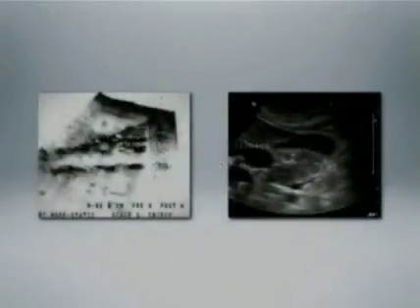If you've been practicing ultrasound for as long as I have, you may recognize the image on the left, which is an old black on white static image of an aorta that was taken in the early 1980s. At that time, static imaging was the mainstream and real-time imaging was not. But the clip on the right, which shows a gallbladder in real time, eventually became mainstream, and now clearly anybody would consider real-time imaging as part of mainstream ultrasound.